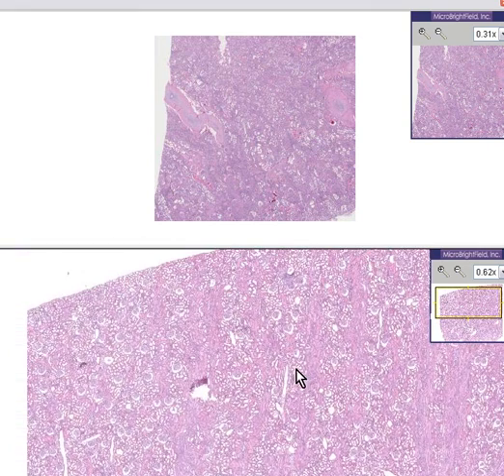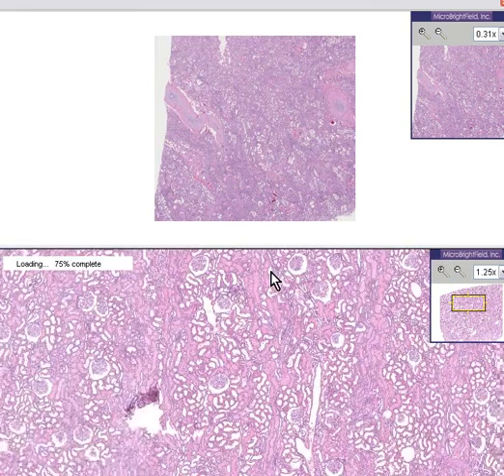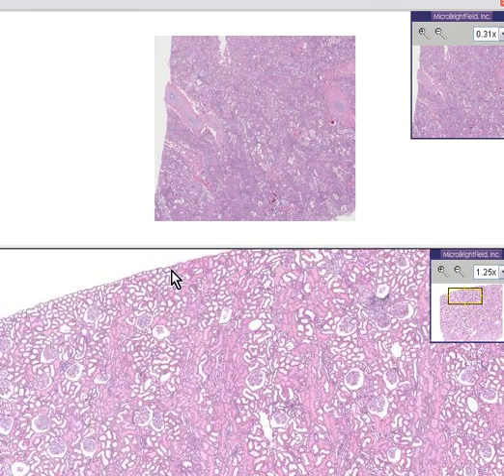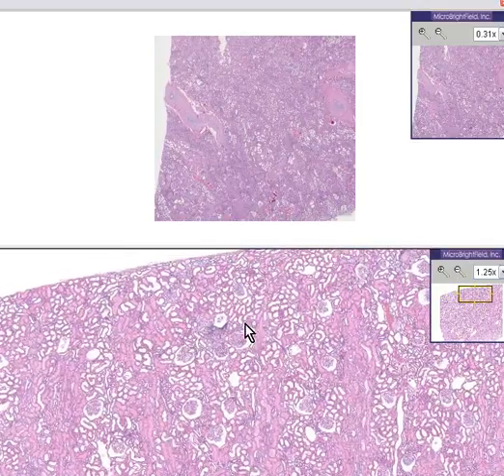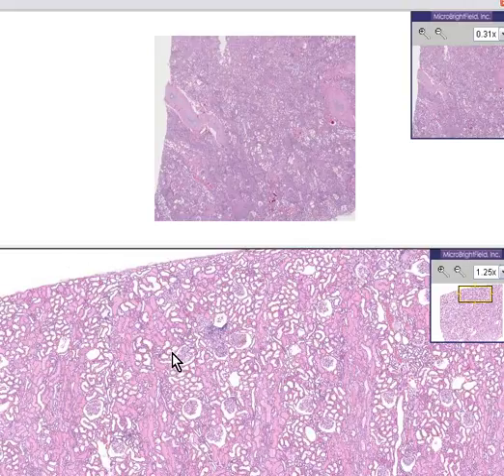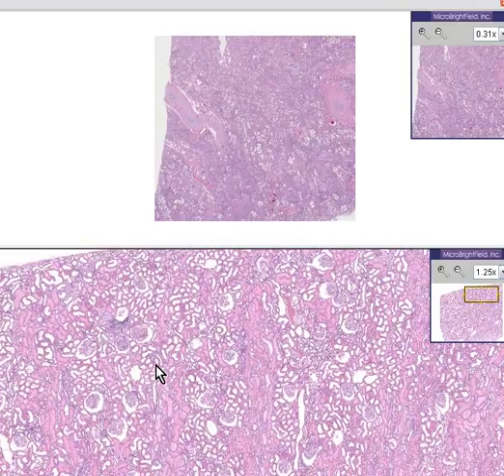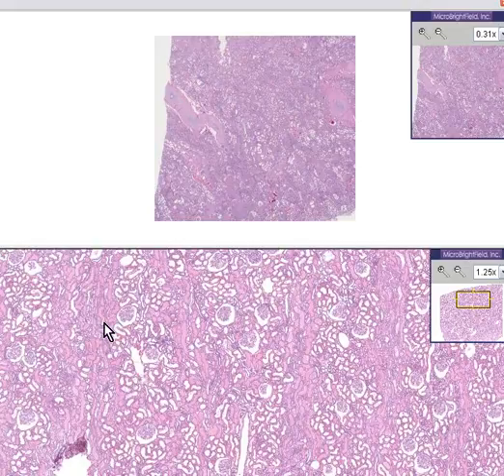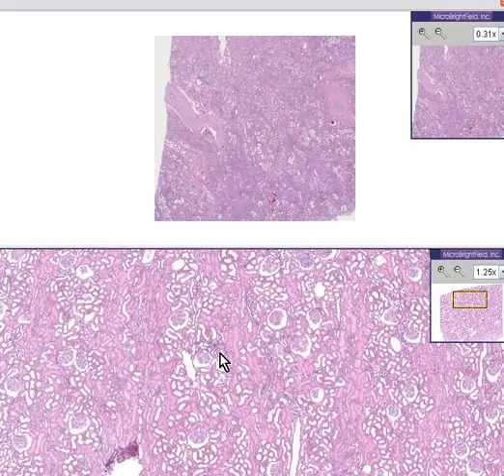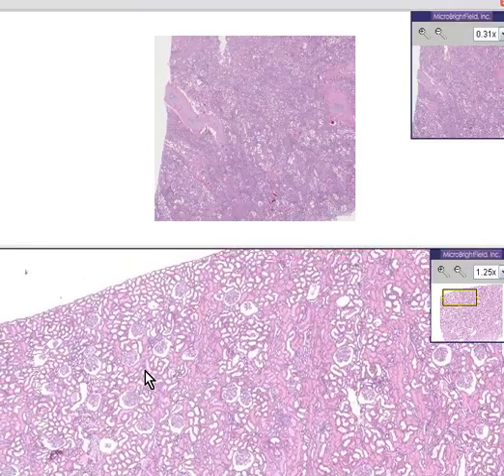Here's a normal kidney. It has a very smooth cortex, a very smooth surface. There are abundant glomeruli in the cortex, none of which are hyalinized. The tubules are nice. There's not much scarring or inflammation within the cortex. This is a normal kidney. Before we look at the microscopic of the abnormal kidney, let's look at what it might look like grossly.